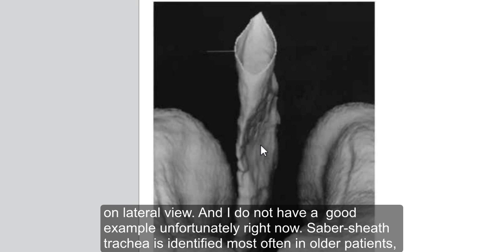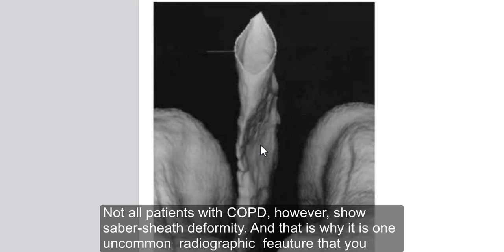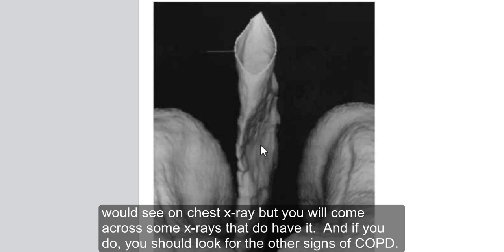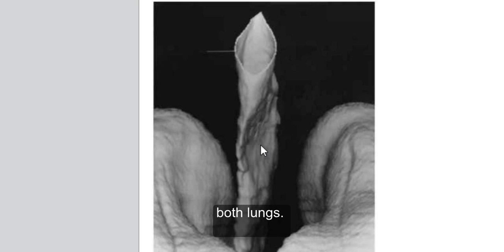Sabre Sheath Trachea is identified most often in older patients, particularly in males over 50 years of age. 95% of patients appear to suffer chronic obstructive pulmonary disease. Not all patients with COPD, however, show Sabre sheath deformity, and that's why it is one uncommon radiographic feature that you would see on chest X-ray, but you will come across some X-rays that do have it, and if you do, you should look for the other signs of COPD, which means hyperinflated lungs, flattened diaphragms, barrel-shaped chest on lateral view, and overall increased air density on both lungs, etc.